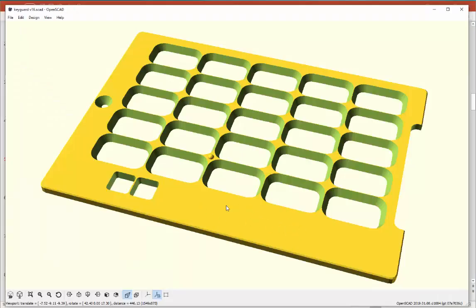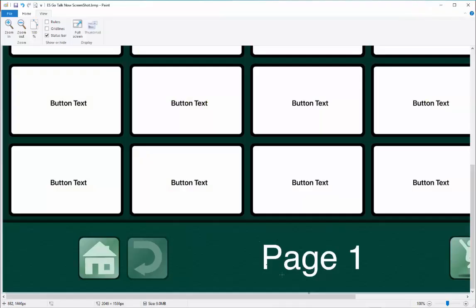So we're going to put Eddie right in here, and I would take those same measurements right off of this, maybe try and put it in the area where it says page 1. But let's go ahead and put that information in.